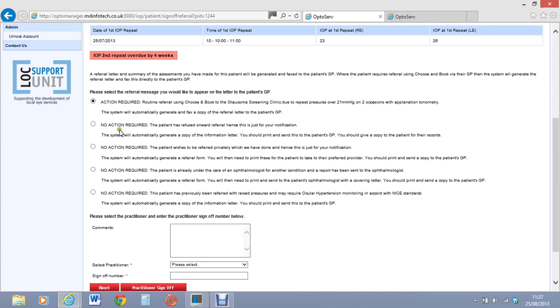Alright. If you then decide, so let's say Mrs. Jackson came in and she didn't come back for her second repeat, and you phoned her and you said, look, Mrs. Jackson, you need to come in for that second repeat. She says, oh, I really don't want to do it. And you say to her, well, it's going to be necessary for us to refer you because of the NICE guidelines. And she says, no, I don't want to be referred to the eye hospital. I really don't. And I'm not going to go, etc., etc.